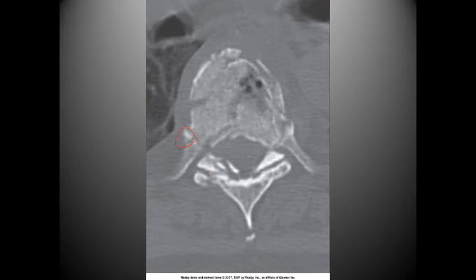costovertebral joint. We also have a fracture running here of lumbar vertebrae, one running here, one running here, and then we also have fragmentation back into the spinal canal. And we also have possible fracture here and here. And so as a result of that, we could have serious compression of the spinal canal and serious impairment of the patient's nervous system, just simply because of this. So it's very dangerous.